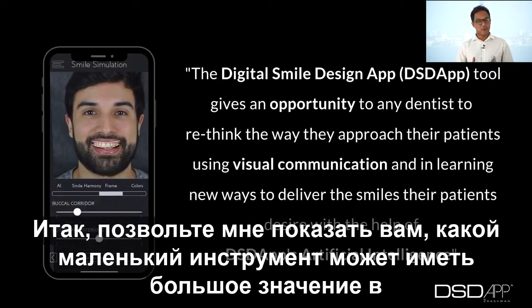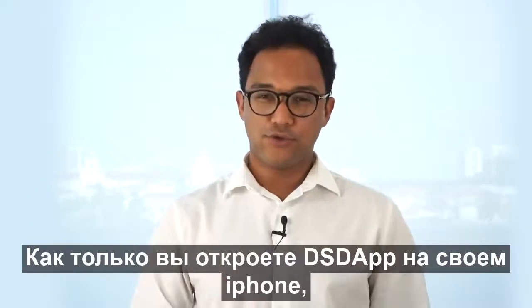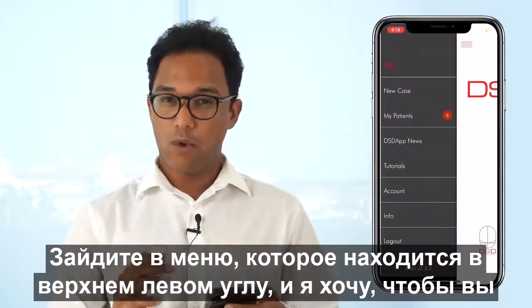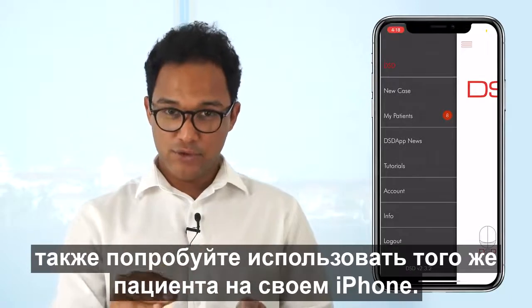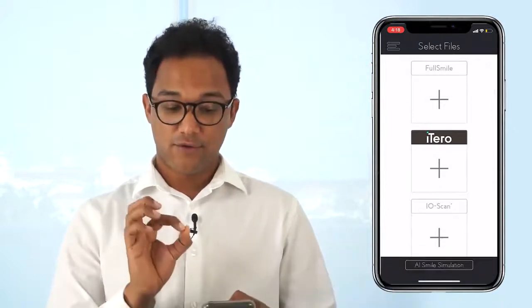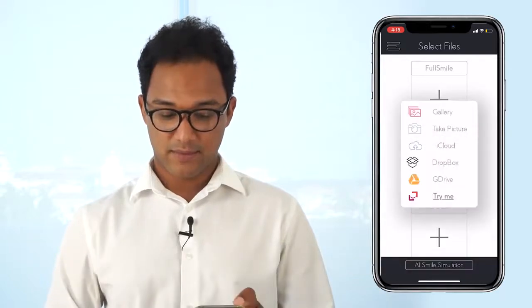So let me show you how this small tool can make a big difference in your practice. Once you go to the DSD app on your iPhone, go to the menu, which is on the top left corner, and I want you to also try the same patient using your own iPhone. So go to New Case, Smile Simulation, and then go to the box where it says Full Smile.